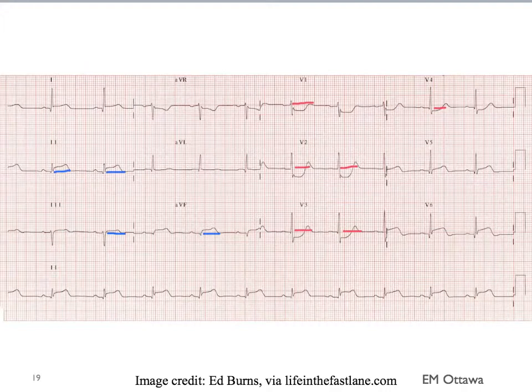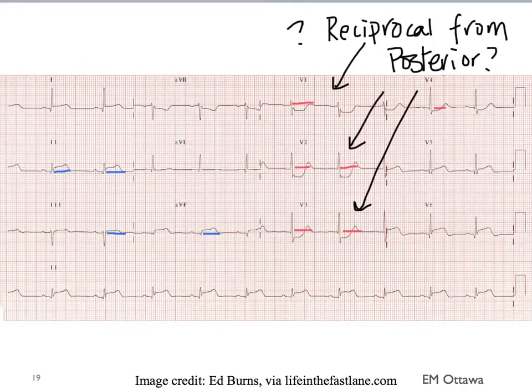And therefore, the anterior ST depression must be coming from something else. It can either be ischemic changes, that we'll discuss later. The second possibility is that we are looking at reciprocal changes in the anterior leads as a reflection from posterior lead ST elevation MI. And therefore, this is one of the reasons we will do a 15-lead ECG and we'll be looking for posterior leads.